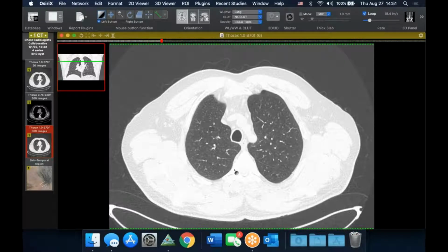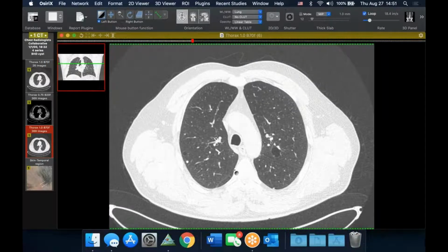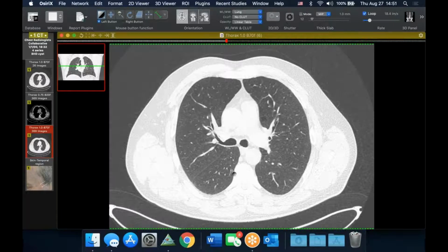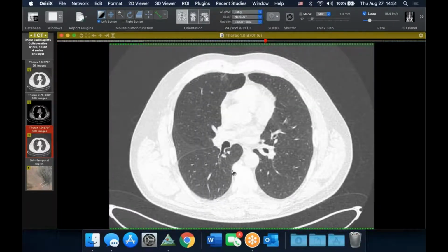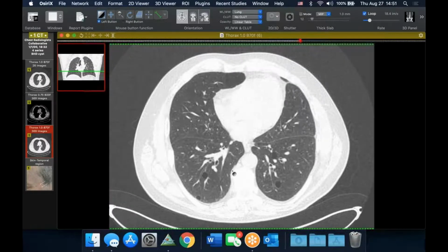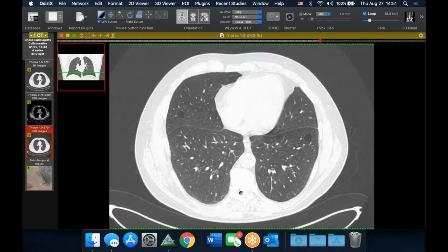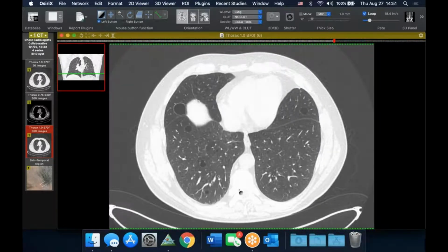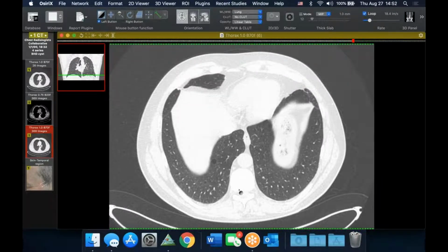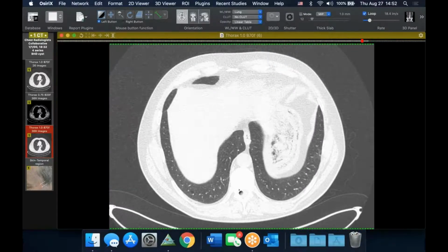These are interesting. In the upper lobe they are rounder, and you might see that more with an LIP pattern. But as we go down, you'll see they become more floppy looking, and they really like to be along the pleural surfaces and on the junction of the interlobular septum and the pleura. And of course, no other cause like connective tissue disease. But I know there was a recent paper that described this floppy appearance. These are perivascular, so I think LIP would be a pretty strong differential diagnosis as well. But in the absence of connective tissue disease, immunodeficiency would be unlikely to have just cystic LIP with not much else going on, and then the fibrofolliculomas.